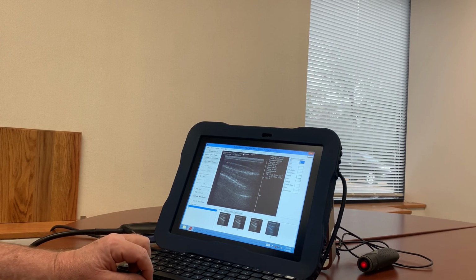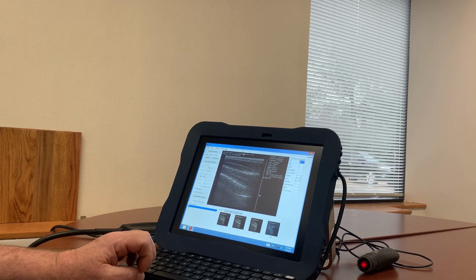So again, this is a great new feature here that we have built into the software, because we do now have the software built into the scanner itself. We can't use the scanner's Loop, but we have a buffer built into it, so it's all incorporated.